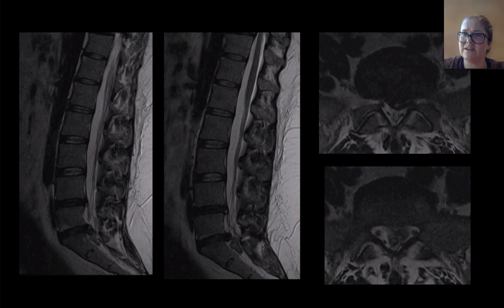So no, I know, Derek, subarticular, I'm going to admit it is not my favorite. Everything from that lumbar spine nomenclature paper I find super helpful and useful, but subarticular is one term I don't love. And I can say a lot of the radiologists in this city don't use it. Sometimes they'll say paracentral or lateral, but technically the term they suggest is subarticular.